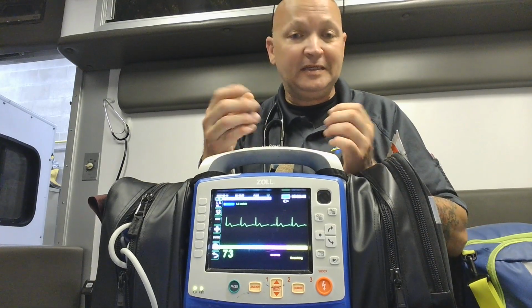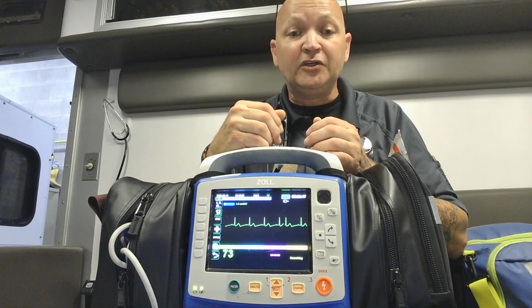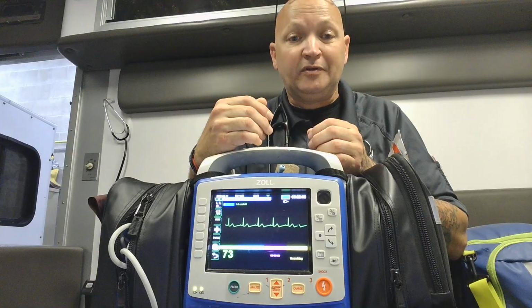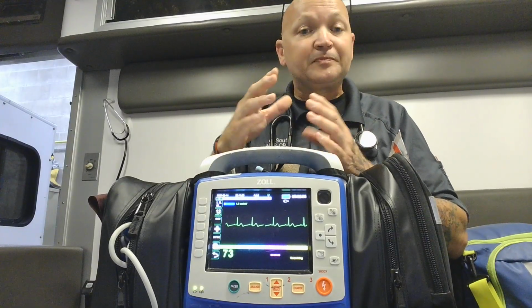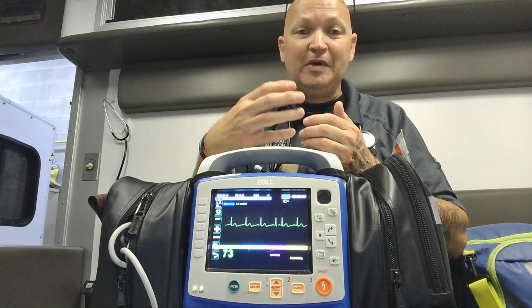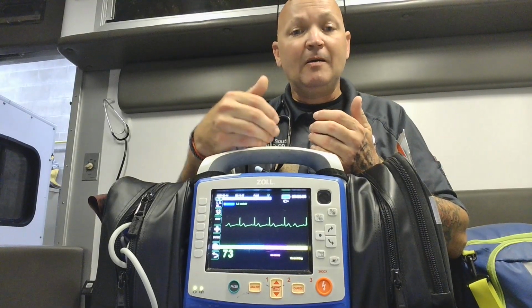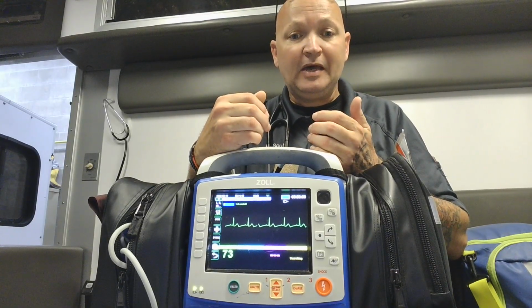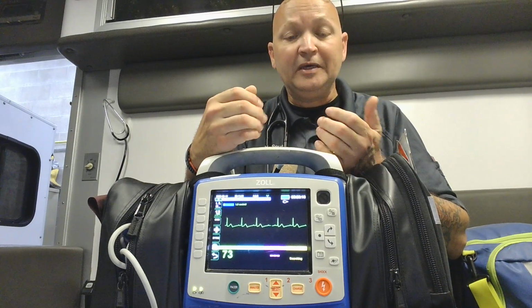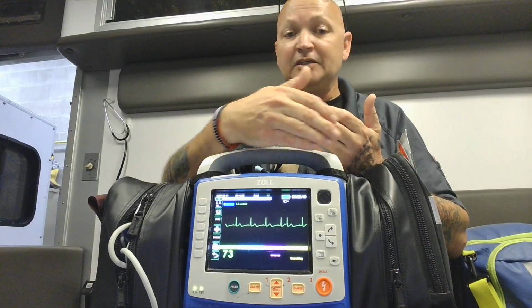One of the big things is that the electrocardiogram shows us the electrical activity in the heart. The first rhythm I'm going to show you is the one on the screen right now, which is normal sinus rhythm, also known as sinus rhythm. Normally, on a good day, your heart will be at a rate between 60 and 100, and when we have this, we have a rhythm known as sinus rhythm. Sinus rhythm means that everything inside the heart is functioning electrically the way it's supposed to. It's the right rate, everything's working correctly, and this is normal.